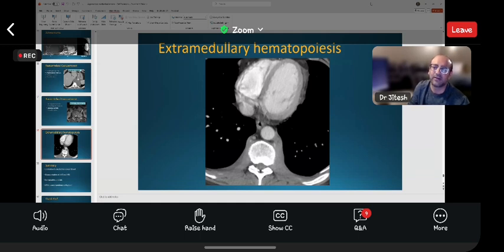Small cell cancers are very aggressive tumors. When the patient has bulky lymphadenopathy, they are most likely invading the airways definitely, and sometimes vascular structures also. Again, the definitive diagnosis is on biopsy, but we can suggest one over the other.